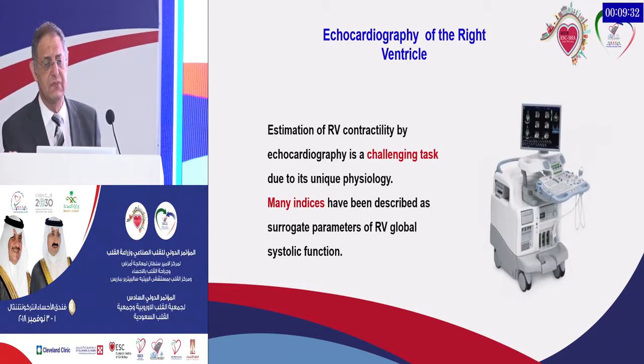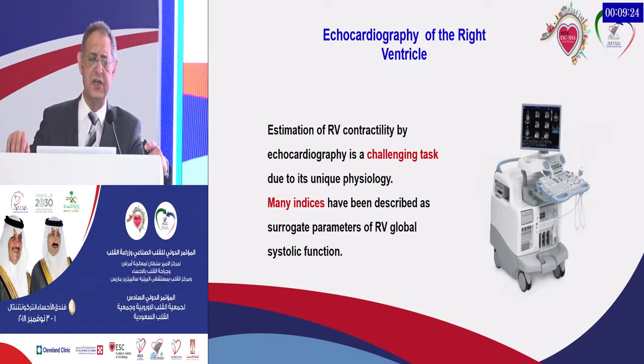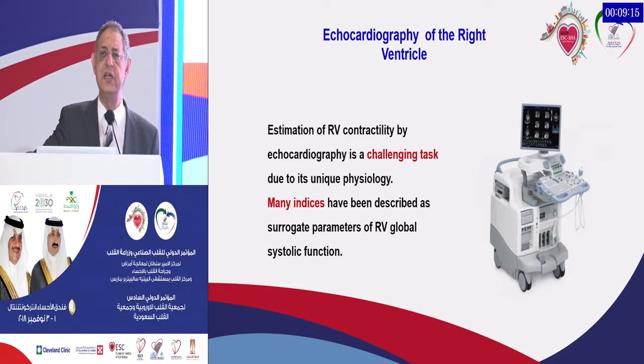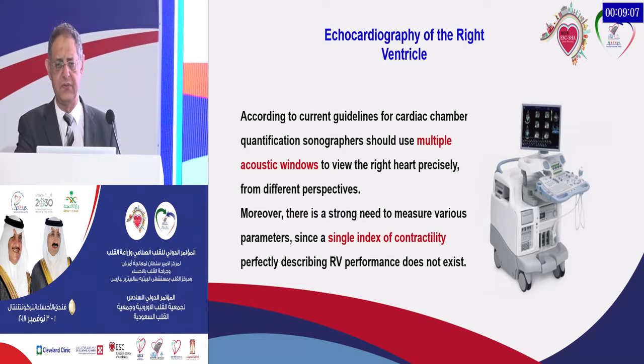So, this is our gold standard or everyday work in assessment of the right ventricle. Estimation of the right ventricular contractility by echo is a challenging task due to its unique anatomy and physiology. Many indices have been described as surrogate parameters of the RV global systolic function.